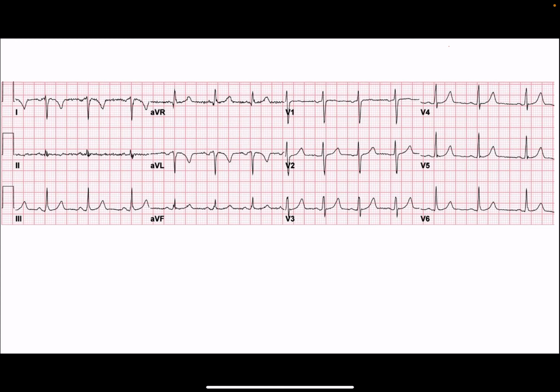And what you are seeing here prominently, in lead one usually the P wave should always be positive. What you are seeing here, the P wave is inverted in lead one. So that is the most important finding. And what else, even the QRS complex is inverted, and even the T wave is also inverted. And one more unusual thing here, see the AVR is positive.